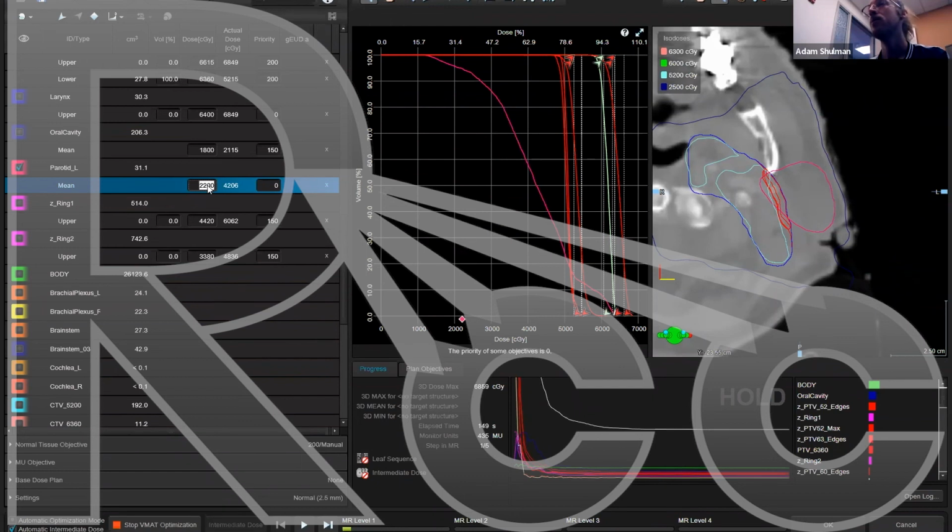If I look at plans that, say, a RapidPlan model has done, or what other dosimetrists or physicists have done, they might have a modulation factor of 4 or 5 even on a really complicated head and neck plan. My modulation factor is less than 3, and my organ at risk sparing is way better. My PTV coverage is a lot higher, but my modulation factor is much lower because I followed a systematic approach that the optimizer understands, and separation of my PTVs.